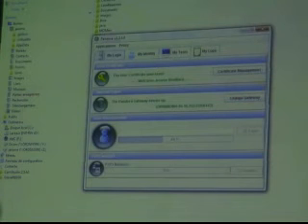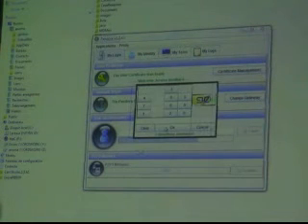So basically your computer is interacting with the access point within the hospital. And then you have to provide your PIN code. So I've provided my 4-digit PIN code, and I'm replicating what I see on the screen for the two last ones.